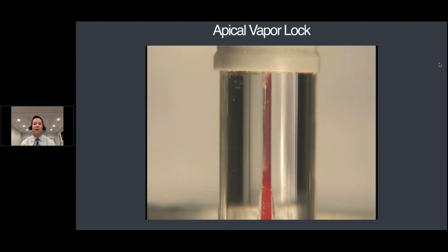This would be an example of putting a gutta percha point or some other point down into the canal. As you see, the air displaces the solution. So whereas we feel lucky that we've gotten the solution as close to the apex as we have here, we're totally blocked out. A vapor lock preventing us from truly cleaning this area. So, a significant concern that we need to overcome.